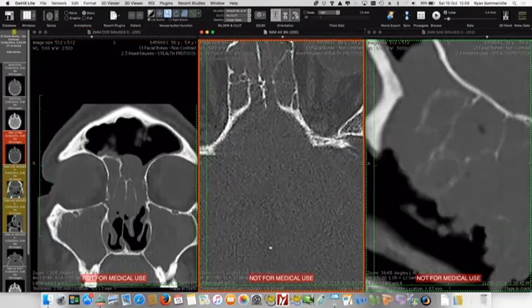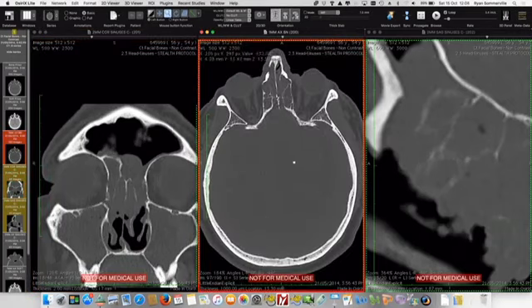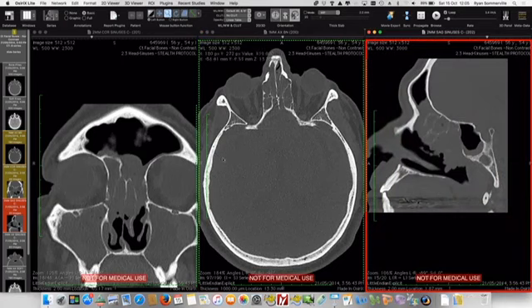What we can see in his situation is the anatomy is the problem in this man. So on this slice, you can see that there is a large left frontal sinus. There is basically no frontal sinus on the right-hand side. So I need to know that's there. If I keep poking up this way, I'm not going to really get very far. It might cause him problems. And on the left-hand side, we obviously need to clear all the way up there before we can clear the disease.